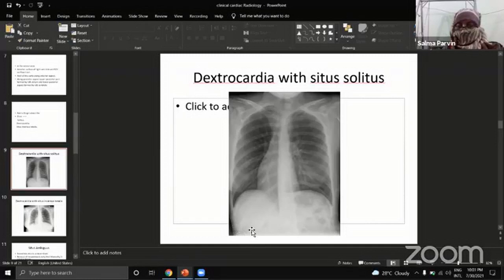produced by the largest organ, an endocrine organ, a mixed organ, not only endocrine, this is produced by the liver. And on the left side, there are the colonic shadows and the gastric shadows occupying the left hypochondriac region.